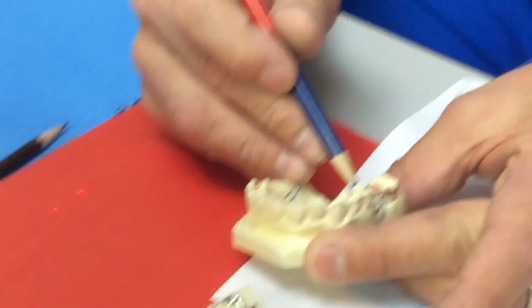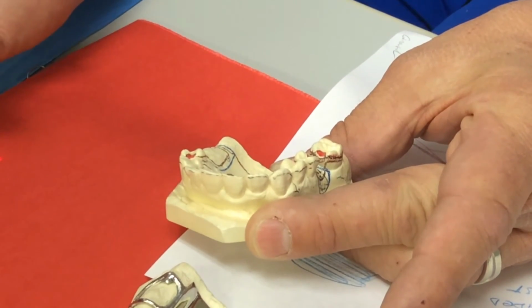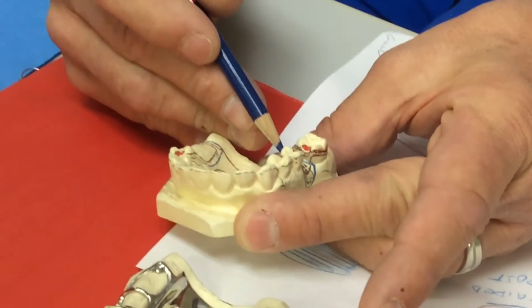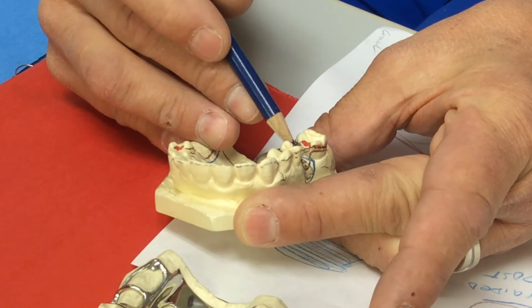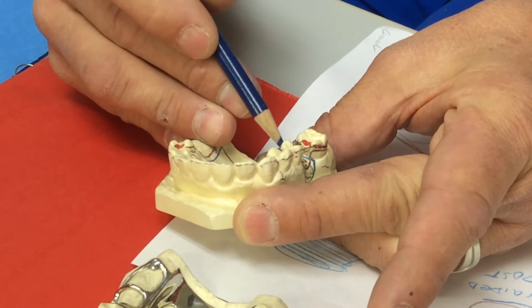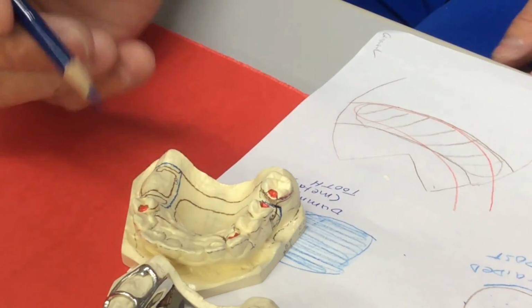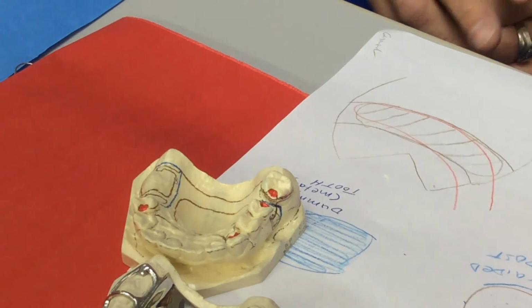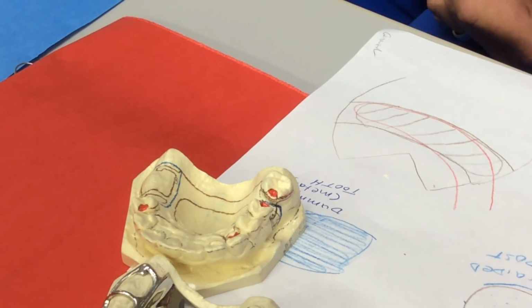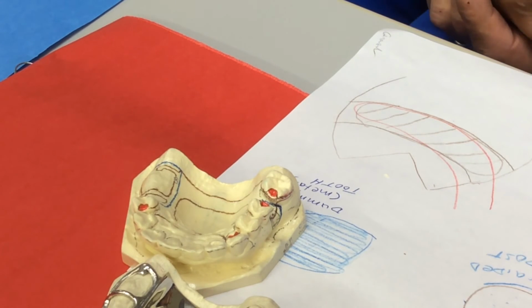I'll rephrase those there because we use the term internal and external in a different way for finish lines. But when you create this finish line and this finish line, you would just color in between the two in a solid blue, and then indicate that you wanted a metal occlusal. Then when they cast your framework, there is just a chunk of metal that is part of the whole framework. The mesial of that chunk of metal is your guide plate. The distal of it is your guide plate, and it would just slide right in between those as your framework goes to place.